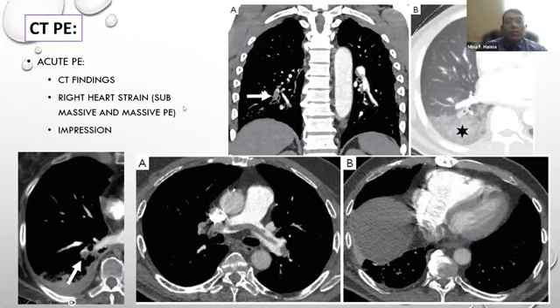Right heart strain: you find right heart strain only if there is an extensive load of emboli, and this extensive load obstructs the peripheral circulation. This obstruction, going acute, increases the pulmonary artery blood pressure, and you see here the right side of the heart is dilated more than the left side, so we call it an RV to LV ratio of more than 1. And the septum, instead of being convex to the right side, is either flattened, or convex to the left side, or bouncing, moving, because of the pressure difference between right and left.